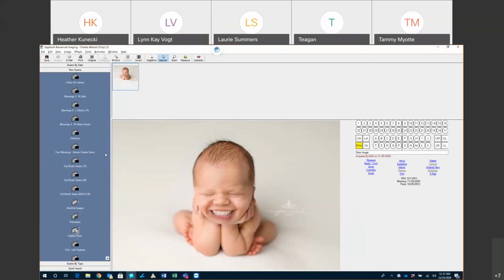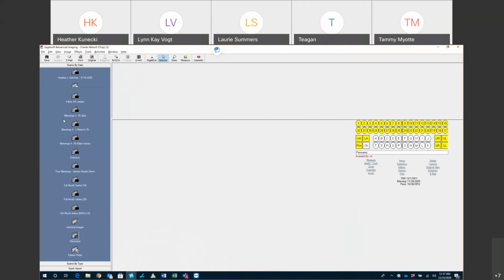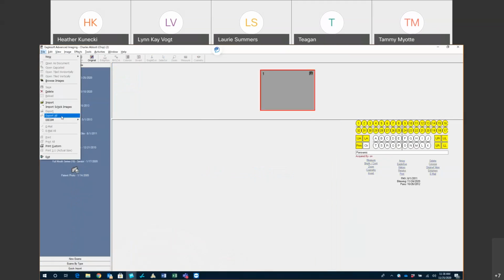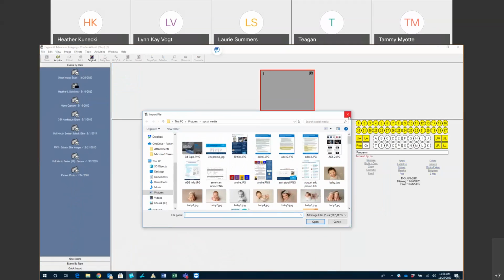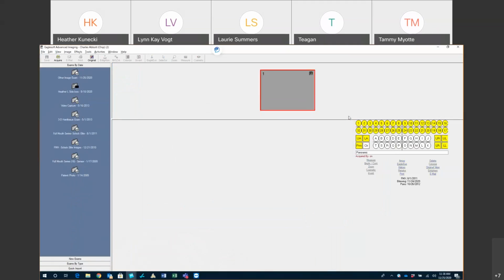Or let's say you have intraoral photos that are sent over from another practice, or bite wings, same thing. Let's say the referring dentist sent you over a pan. You could just go to import. You just choose your pan, and then you go to File, Import, and choose whatever photo you have saved to the desktop, and then you can import it in that way. So that's how you'd import old X-ray exams if you need to, or new ones from another practice.